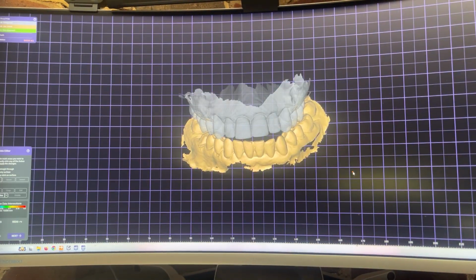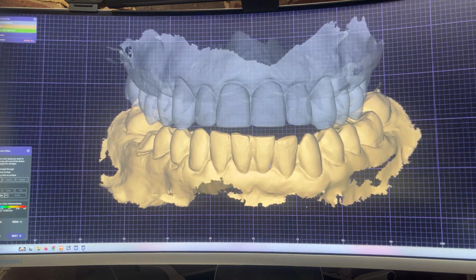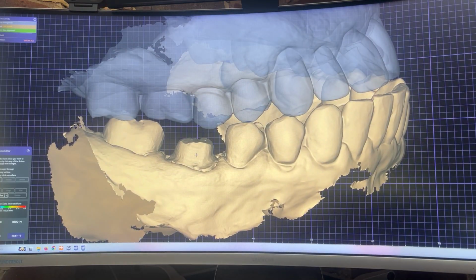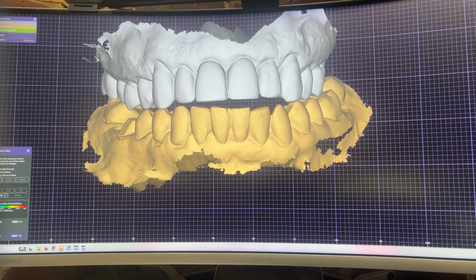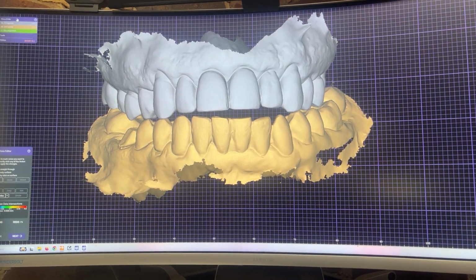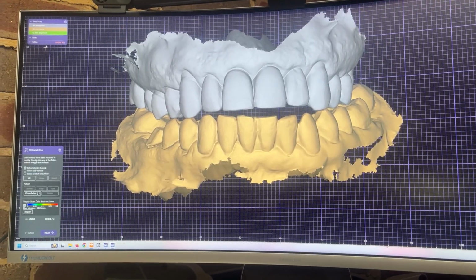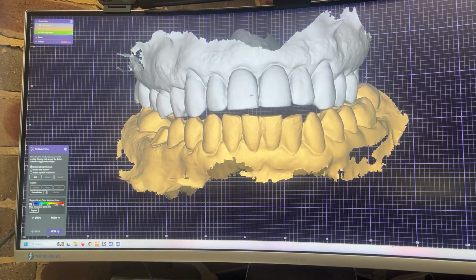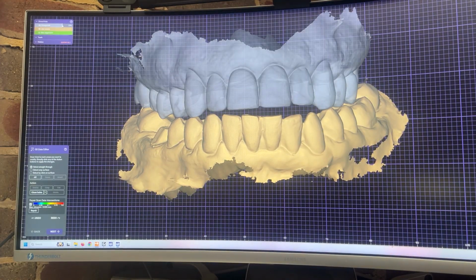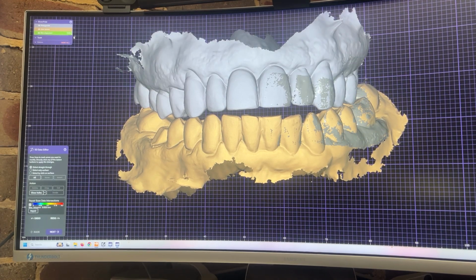So it's all here. You've got the jaw scan, the lower jaw scan, which is the prep here, the 4-6 I'm going to be making, and this one here, the antagonist. You can see the top corner here where my mouse is. These are all the different scans that will be imported here. And this is the fade bar. You can go in and out like this. Both, and there's a bite alignment scan as well, just to double-check if it's right.